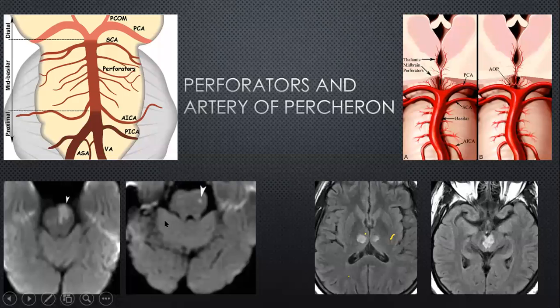And these are some of the sequelae of the occlusion of these perforators. This is a basilar perforator stroke. You can see how the midline is respected, because these perforators typically will supply one half of the brainstem at that level and can result in strokes in that territory.